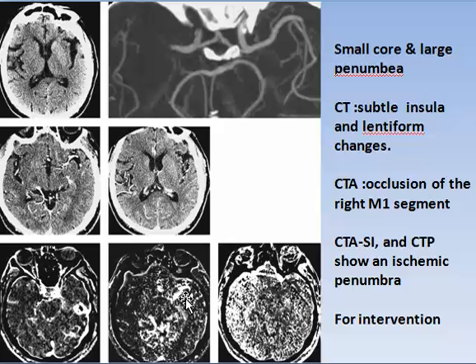So how to know the penumbra? You have three. One, the CT without contrast with the CT with contrast. You will find that difference. And here there is extension of the infarct down, low density area down. So you start to see, and you know that there is some extension beyond this core. But the exact is to study the differences between cerebral blood volume and cerebral blood flow.